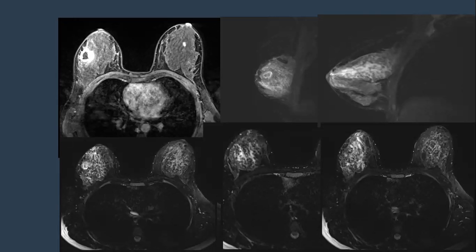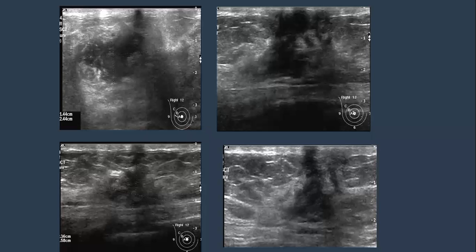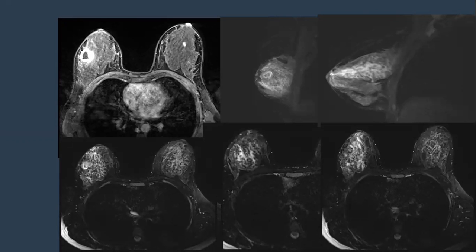But if you look at the ultrasound, the lesion is not at the midline, not exactly central. Look at the cursor, and even here on MRI it is a little bit off midline. And look for the edema, and look for the segmental ductectasia, and the surrounding edema on T2.